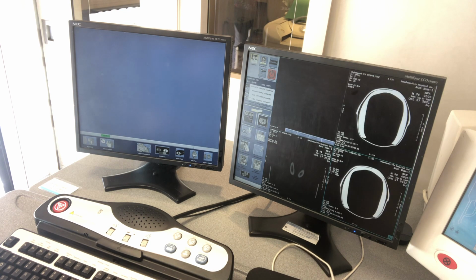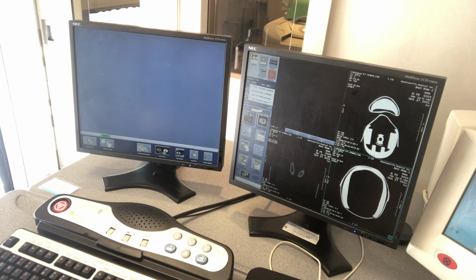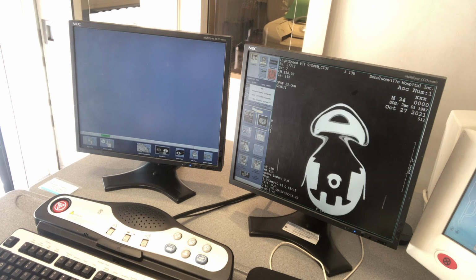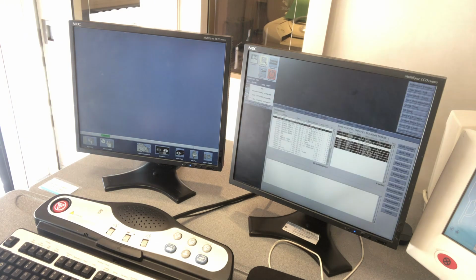Okay. So it's still scrolling through there. And it tells you over here a percentage of completed. Okay. So now it says idle, which means complete. So you can toggle your switch and you can actually scroll through your images. Everything looks good. So now we are going to go up here to the middle little button that's ImageWorks.